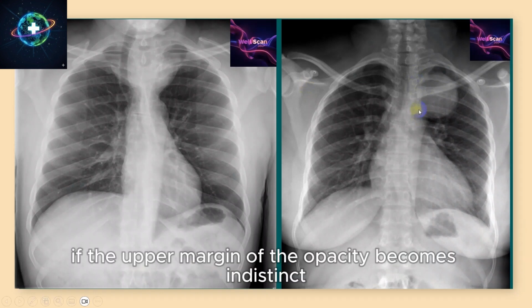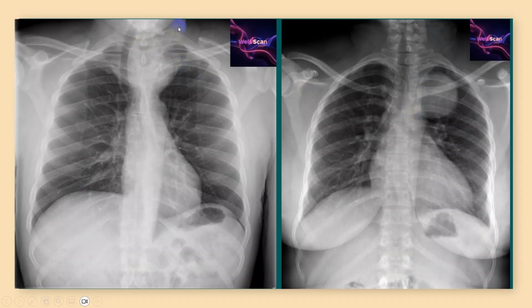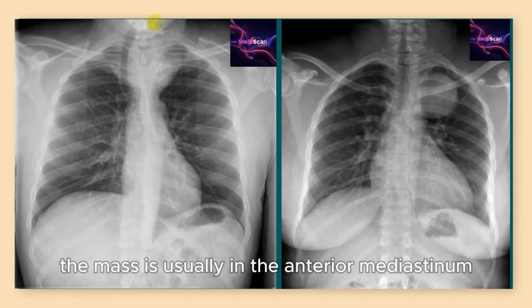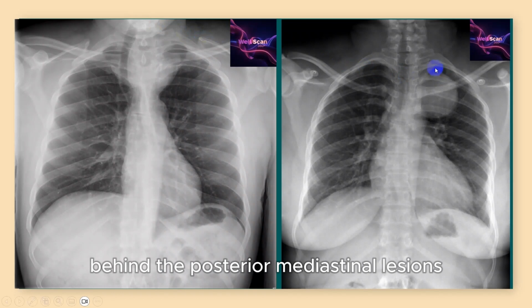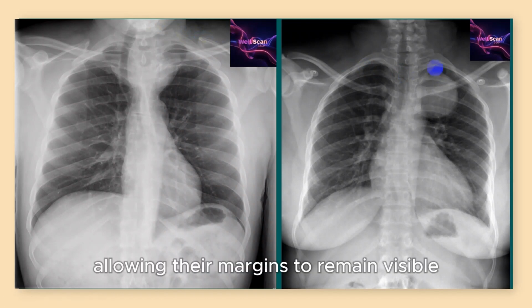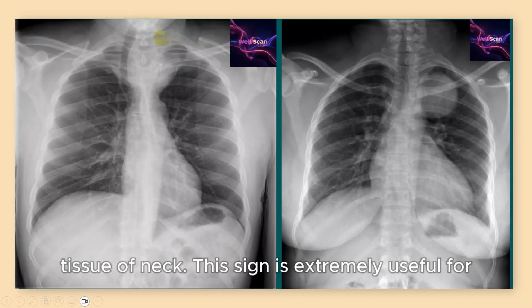On the other hand, if the upper margin of the opacity becomes indistinct or disappears at the clavicular level, the mass is usually in the anterior mediastinum. This happens because posterior lung apices provide contrast behind the posterior mediastinal lesions, allowing their margins to remain visible. Anterior lesions lose their silhouette against the soft tissue of the neck.